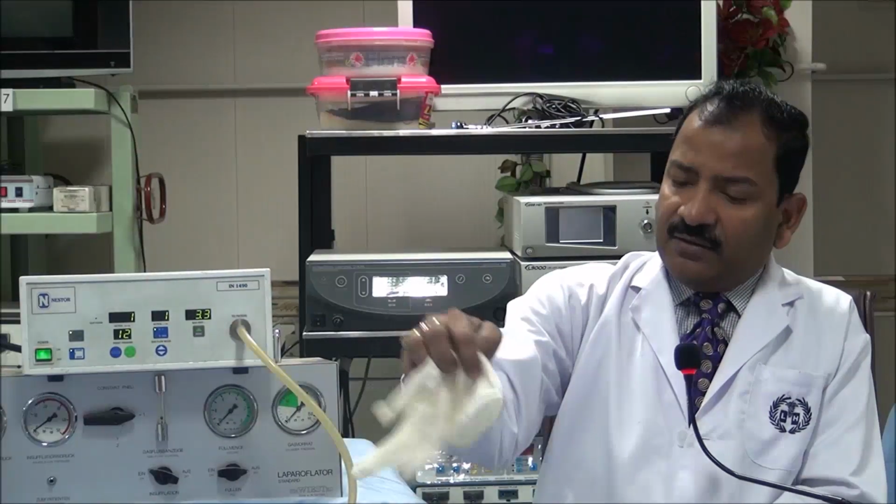But if you have a cannula, suppose this is cannula, now it is not possible to work with the 1 liter per minute. Do you know why? Because I have to use many instruments, 3-4 cannulas are there. And suppose this is distended now, and suddenly it collapses, then again I have to wait a lot of time to get it distended.